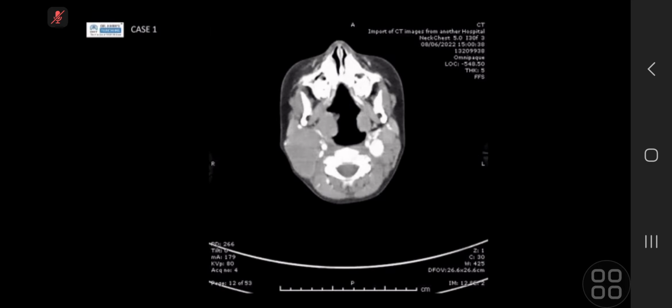This is a highly vascular tumor. It could be done with a CT scan. It is paraganglioma, and also we don't need to do a biopsy from here. I will communicate my findings to the referring physician and refer the case to the head and neck surgeon.